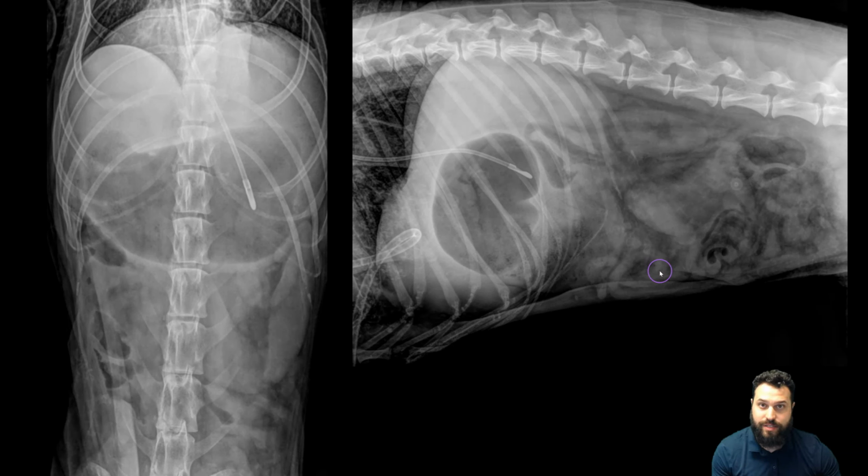If we have small intestinal obstruction, we should have at least some distended segments. We've talked about some of those in recent cases, so you can go back and watch some of the older Reading Room videos looking at some examples of mechanical obstruction. We notice that there is always evidence of some distension of intestinal segments, whether it's just the segment with the foreign body in it, or larger populations compared to the smaller ones. In this instance, we really have a pretty empty small intestinal tract.